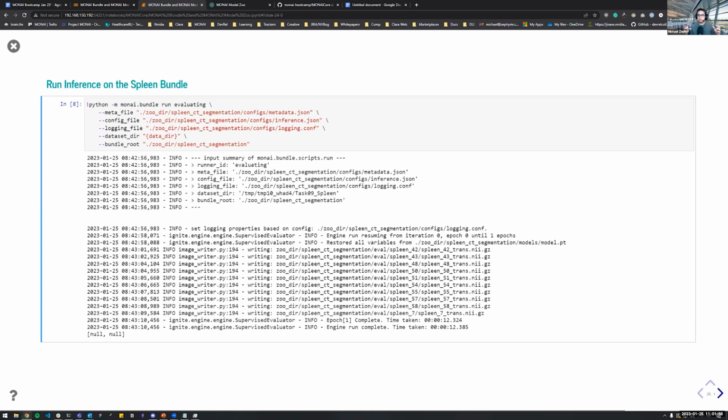If you want to simplify it and use some of these models, all it really takes is your data, get the bundle, and make sure some of the arguments match up, or you can go and modify the config files themselves. And then you can rerun on another data set and do training and fine tuning on a different data set. So you have a lot of options, and it's a pretty easy way to get started because it's pretty minimal changes, and it makes it really easy to reproduce the experiment that you might be doing with your bundle or model.